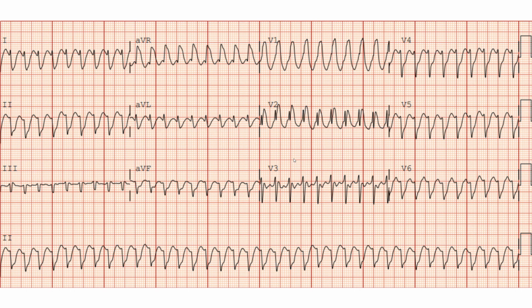Other things on here which point more towards ventricular tachycardia is this lack of consistent morphology in the precordial leads. In VTach, you would expect all the precordial leads to be pointing in the same direction, and these ones are not. You can see this peak is upright and maps out to about one small box after this big line. Same thing here, but when we follow this down, it doesn't. It's down here. So most of this stuff favors ventricular tachycardia.